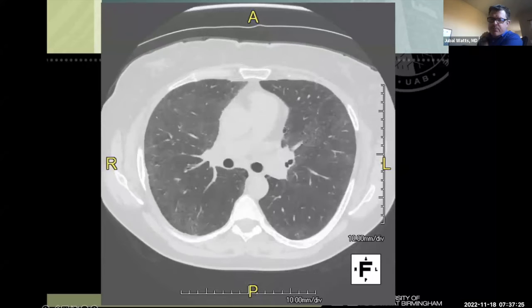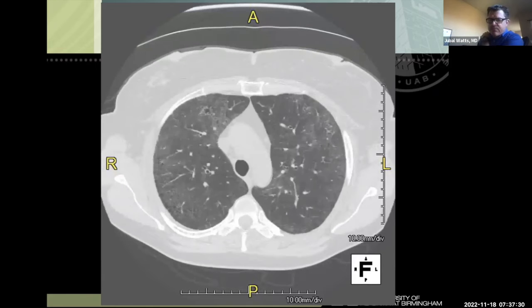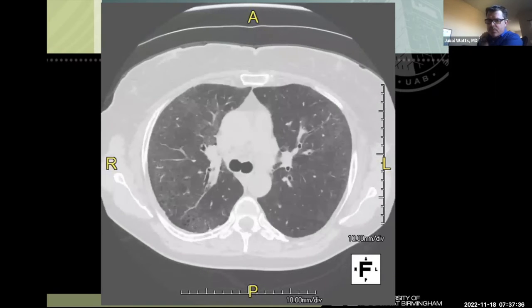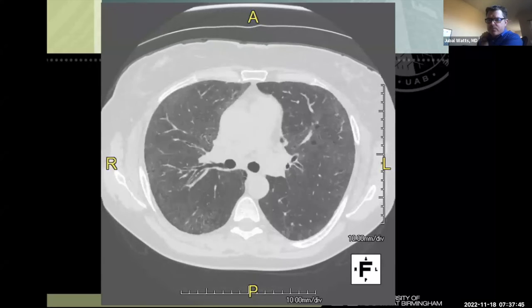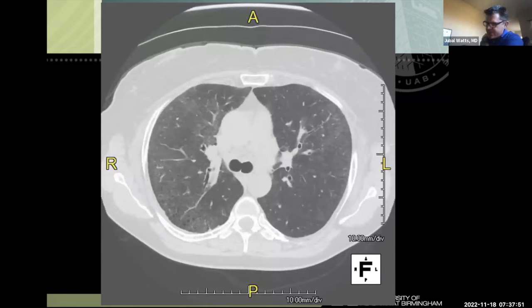The predominant abnormality will be ground glass, but you can also see non-honeycomb cyst-like changes, especially in the areas of ground glass. They'll frequently have emphysema, and they will have manifestations of respiratory bronchiolitis, those poorly defined centrilobular nodules. DIP is in a spectrum of smoking-related lung injuries. So all smokers, even if they're asymptomatic, will have respiratory bronchiolitis, which is like the smoker's macrophages that surround the terminal airways. If they become symptomatic from that, then it's respiratory bronchiolitis, interstitial lung disease, RB-ILD.